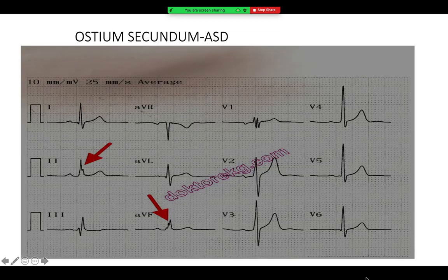So what are the typical features which we all can identify for these different congenital heart diseases? For example, atrial septal defects, we all are aware there are different types of atrial septal defects like ostium primum, ostium secundum. So if we come across this kind of ECG, what do we notice? So I have already given the diagnosis, right? Ostium secundum it is. So what are the peculiar things, characteristics, I would say? So to help you there, we have already put up some arrows as well.